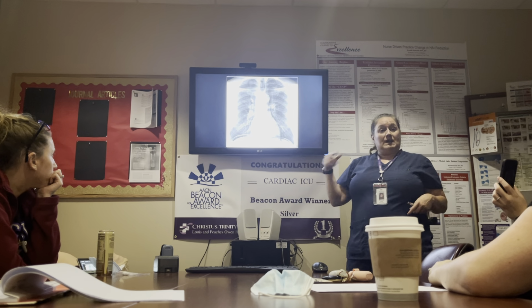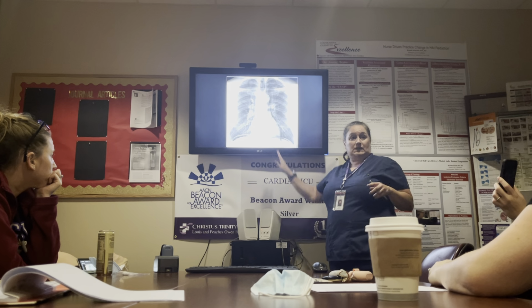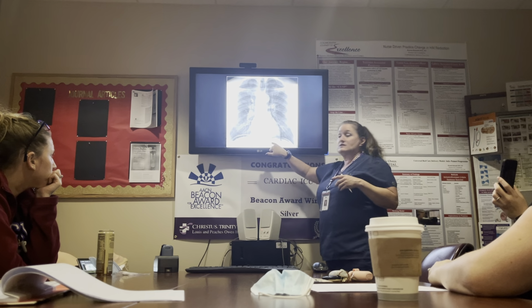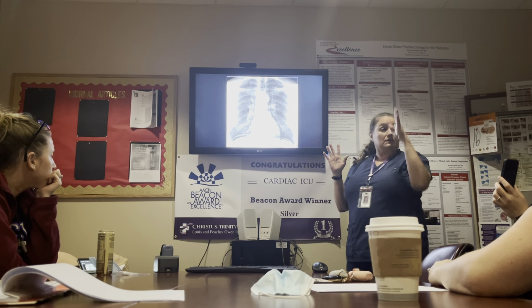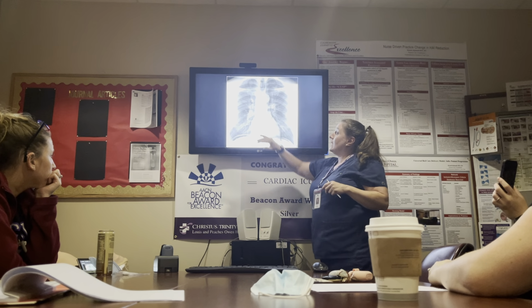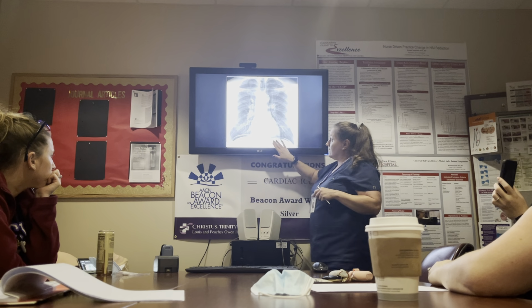Reverse scenario, you may have had an abdominal procedure that had air in the abdomen, and it's going to rent up that direction, and it's going to rent up through the mediastinum because your esophagus goes through a little hole down here in your diaphragm to be able to communicate. So that air is going to go whatever way is, again, the path of least resistance. So you may have pneumomediastinum and free air under the diaphragm, but that's what free air looks like. That's not a gastric bubble, that's free air.